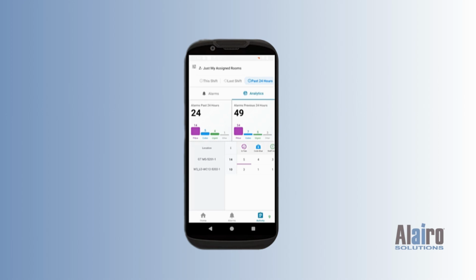If you want to break this out further, you can see that there were 5 in-pain calls, 4 code blue calls, 3 staff assist calls, etc. The icons are also configurable. In your analytics, you have different groups. So we have pillow speaker calls, we have our code calls, our urgent calls, so you do have those diagnostics.